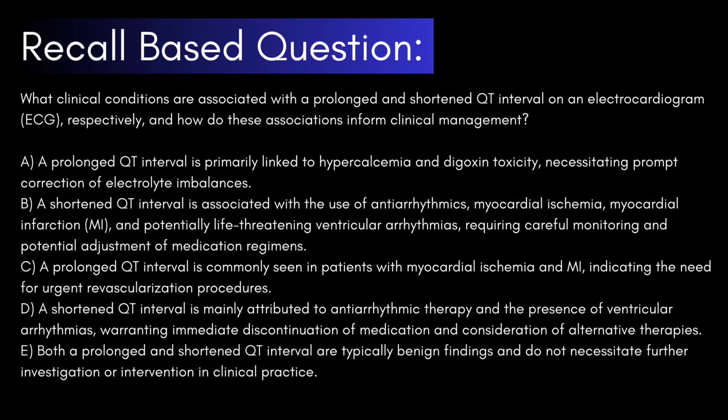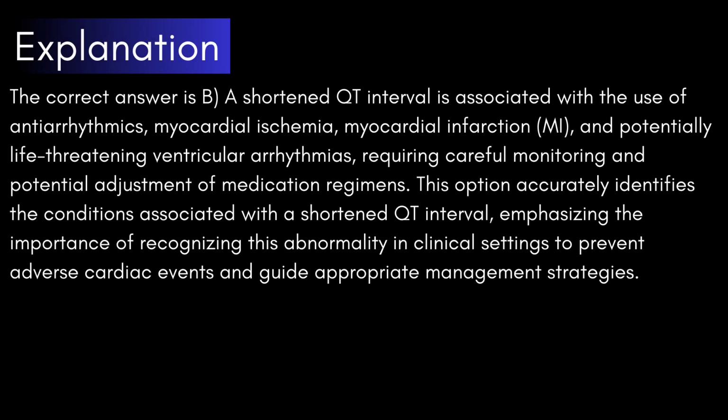All right, I think I gave you guys enough time here. I'm going to move on to see what the correct answer is and what the reasoning behind it is. If you need more time, feel free to pause the video. Otherwise, moving on now. The correct answer is B.